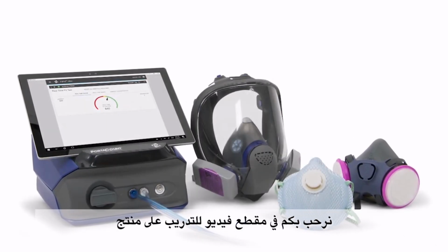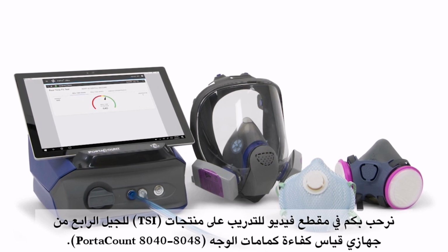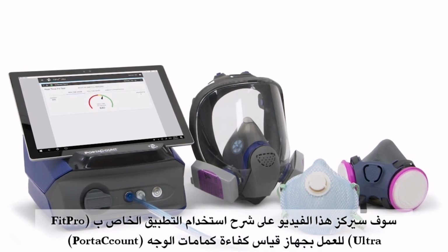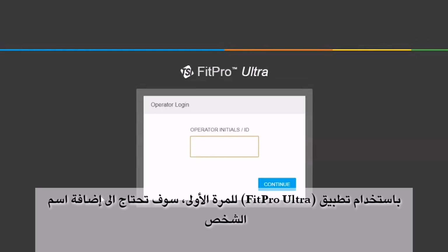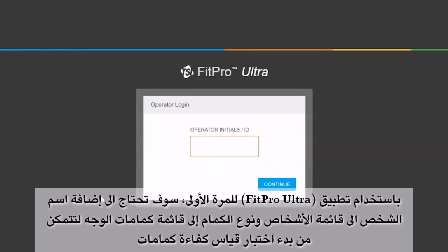Welcome to the TSI product training video for the 4th generation PortaCount respirator fit tester models 8040 and 8048. In this video, we'll walk through the initial startup of the FitPro Ultra software. Because it's your first time using the FitPro Ultra software, you'll need to add a person into the people table and a respirator into the respirator table in order to start a fit test. After that is done, we'll set up and run through a fit test.